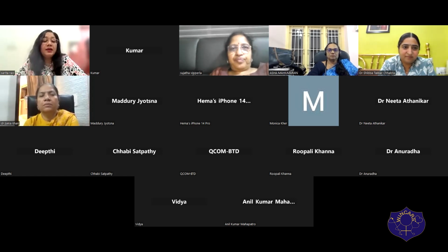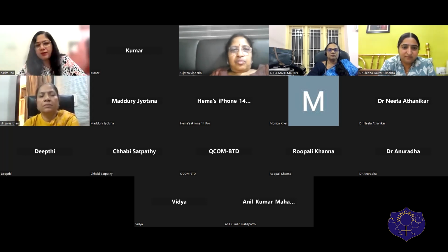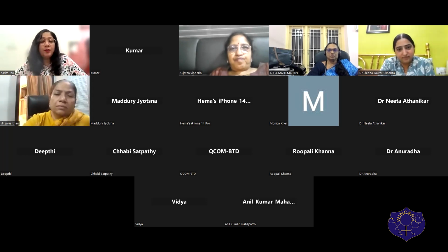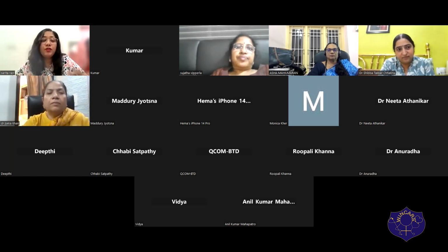So orbital needs very, very vigilant operators, is what I will say, because you can have a perf. With rota, the perf risk is less, but the slow flow is phenomenal. With rota, bradycardia is there, hemodynamic changes are there, slow flow is there. With orbital, no slow flow, no bradycardia, no hemodynamic changes, but the risk of perf is there. The moment you have a dissection, stop.